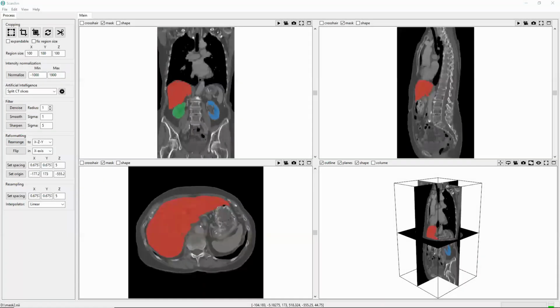The following is a tutorial for the image processing functions in ScanXm. ScanXm includes some very basic functions for modifying or filtering medical images. These functions are added to help with your annotation or segmentation tasks, to improve the visualization or correct any problems with the images you loaded.